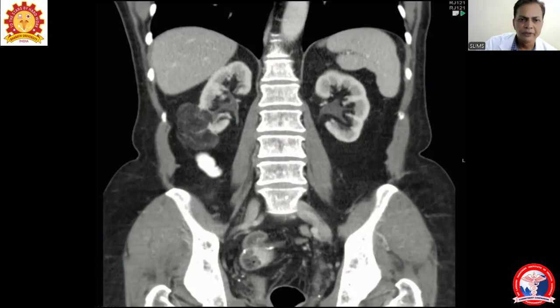Angiomyolipoma comes in different sizes as well as different kinds of patterns. This is a single angiomyolipoma with very clean adjacent fat, and though it's a relatively large lesion, it is not distorting the kidney in a violent way. It must be a long-standing angiomyolipoma.